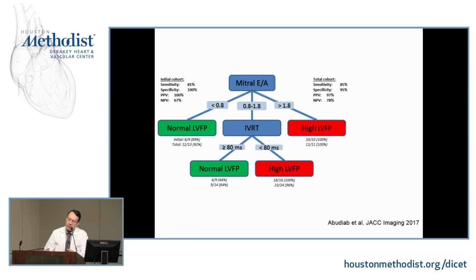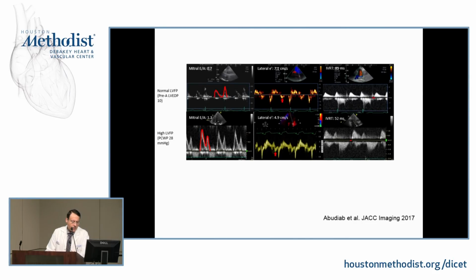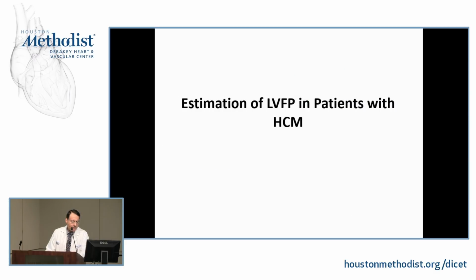So yes, even in patients with mitral annular calcification, you can still provide reasonable assessments of LV filling pressures. And these are examples for patients with normal and elevated filling pressures based on the mitral inflow and IVRT.